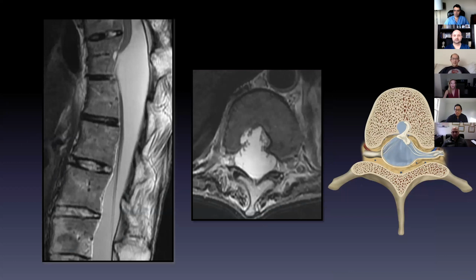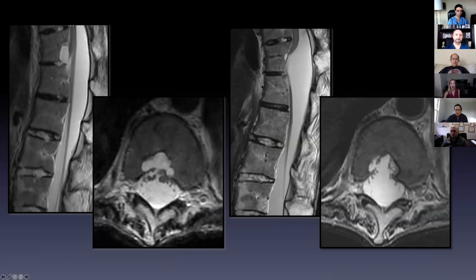This is a much more dramatic case. This is a case of ankylosing spondylitis. This case, very marked deformity, as you can see. Let me skip to the next one. This was in a matter of 3 years between these first two images and these two images. The pulsations and the ventral herniation of the cord really progressed. And what I wanted to ask you, if there was time, if this person is symptomatic, how would you treat someone like this? Or can you treat them?